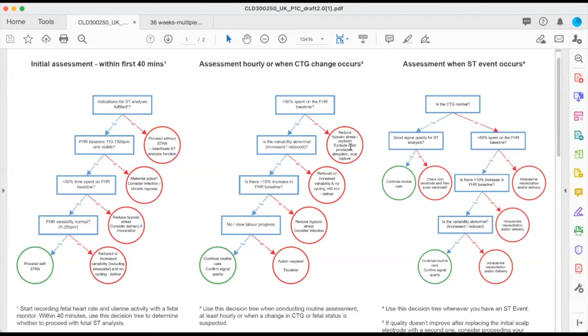So if you have a loss of contact for more than 4 minutes, the reality is you might have missed an episode of increase. That's where the 4 minutes thing comes. If you've had a break of more than 10 minutes, you might have had a baseline change that was missed. That's where the 4 and 10 minutes comes. You basically need to make sure that the baby has enough contact to give you the signals.